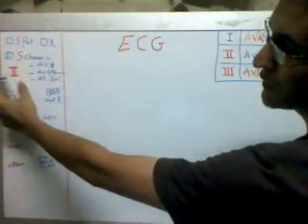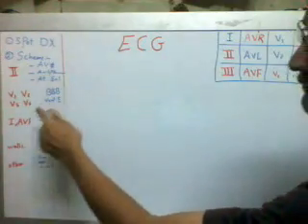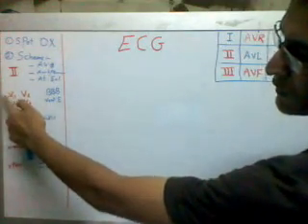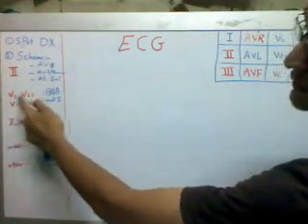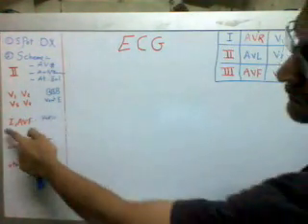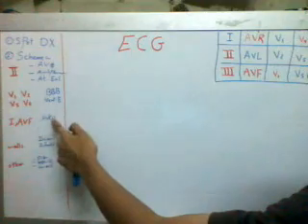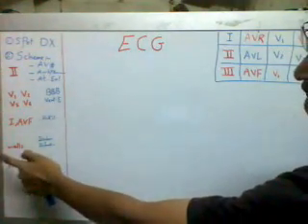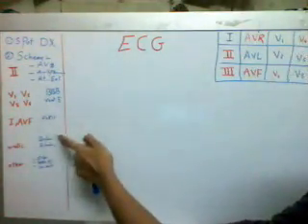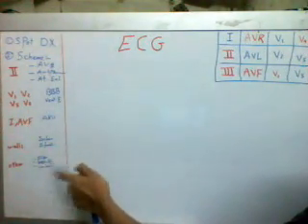We look at lead 2 and look for AV block, arrhythmia, and atrial enlargement. We look at V1, V2 as the right part of the heart and V5, V6 as the left part of the heart, to see bundle branch block and ventricular enlargement. We look at lead 1 and aVF to detect the axis. We look at the walls, inferior wall, high lateral wall, lateral wall, to look for ischemia or infarction. We look for the others: digitalis, hyperkalemia, or low voltage.